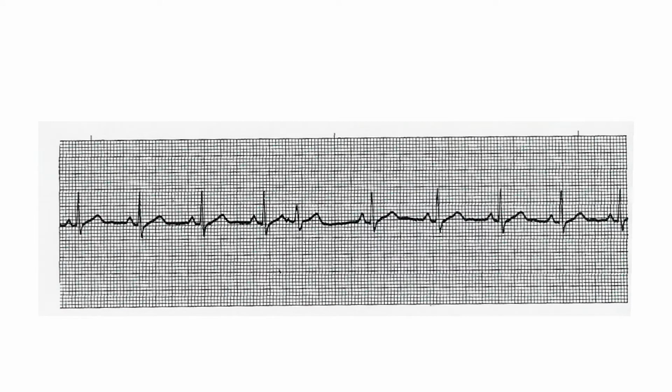On 7-46 on page 118, in this one on the 5th complex you have a PAC. And note the aberrant conduction. When we talk about aberrant conduction, the impulse traveled down, but it just traveled down differently. So it's going to give a different looking QRS compared to your normal QRS. But that's okay, it's common. There is a P, it's premature, it came early, and then it went right back to the patient's sinus rhythm.